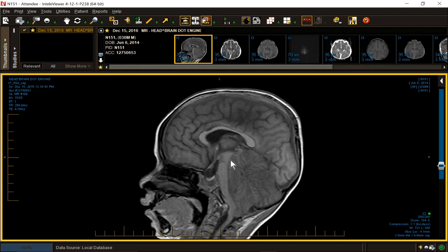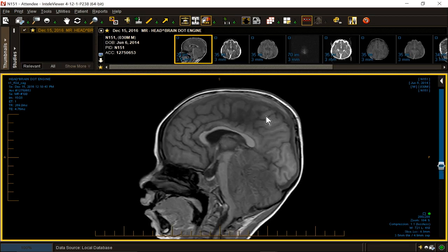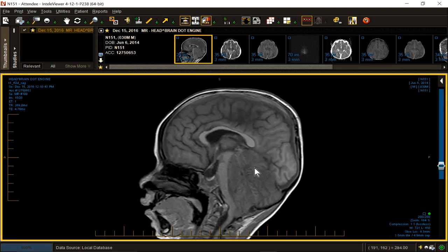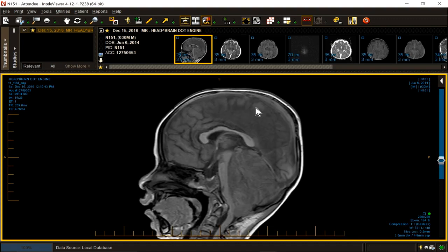And I check to make sure all the radial anatomy is preserved. The cingulum, the corpus callosum, around the corpus callosum, the indusium griseum. There is our cingulum. There's our cingulate sulcus. It terminates in the supramarginal or marginal sulcus. Anterior to it and oblique to it, although not well seen, is the central sulcus of Rolando. We've got cuneus, precuneus, paracentral lobule, all discussed before.